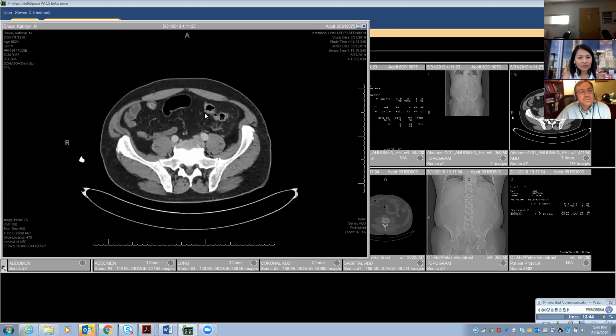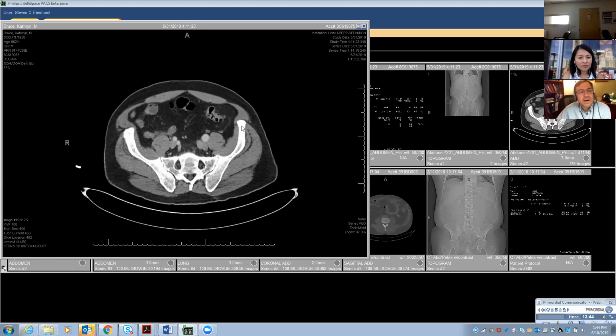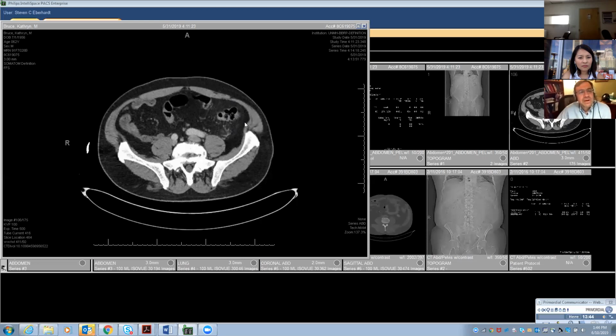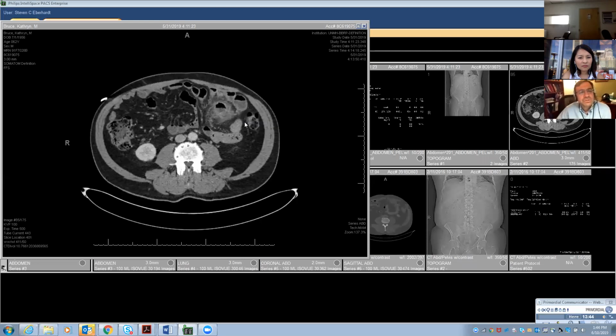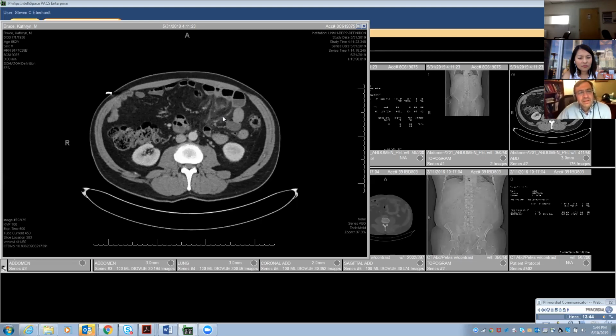So this is part of the colon here, and as you're going above the colon into small bowel, you have abnormal small bowel, and then an inflammatory process that includes this area that kind of looks like it's not following the central luminal bowel, but looks either peripheral or extrinsic to bowel.